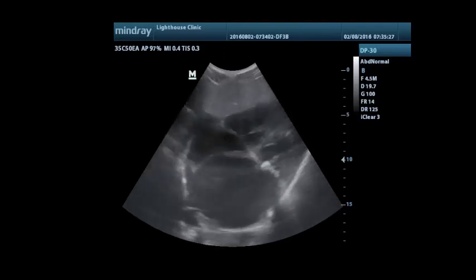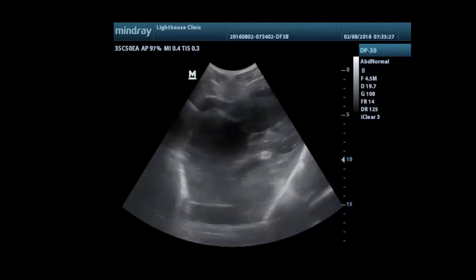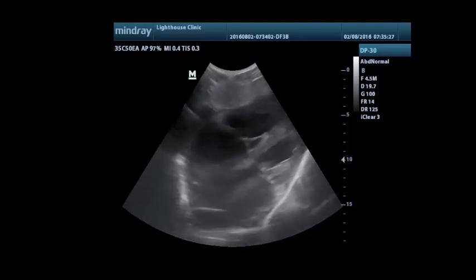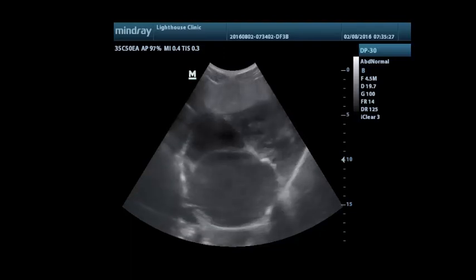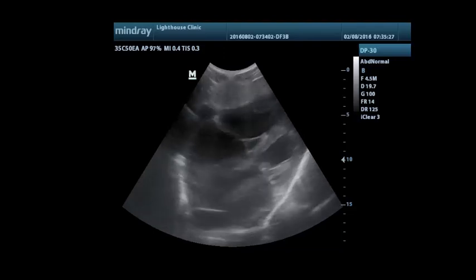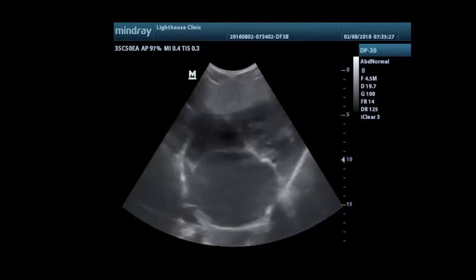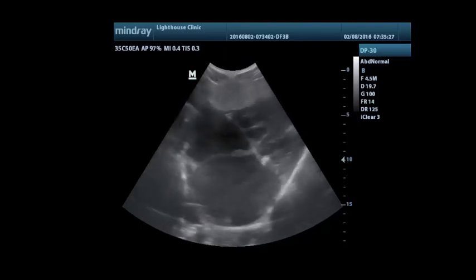So basically, by comparing the left atrium with the left ventricle, we get an idea that there must be some problem with the inflow of blood from the left atrium to the left ventricle, and that is a hallmark of mitral valve disease. And mitral valve disease is most commonly caused by rheumatic heart disease. So that's what we are looking at here in our question number 4.